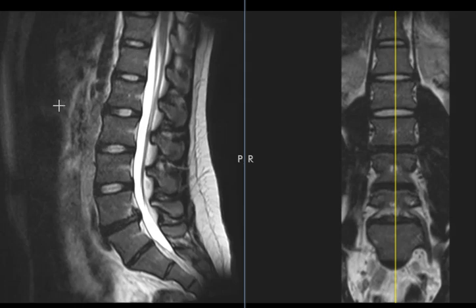We can see towards the front over here, this is the belly button to get oriented. This bright area is the normal subcutaneous fat in the back. These squares are the vertebral bodies of the lumbar spine, and then down here is the sacrum and coccyx. Now between one of these squares we see a little area of brightness here. This is a disc. This is a soft disc that acts as a shock absorber.